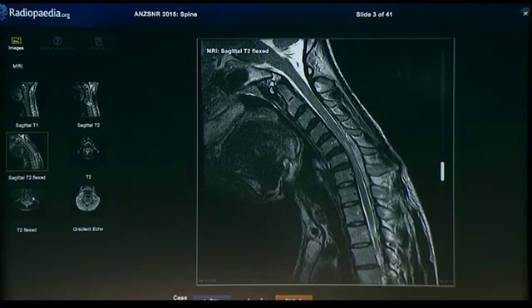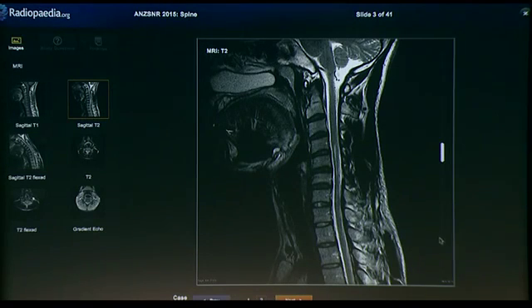So this is actually a fairly classic end-stage case in a patient who's 30. Now the classic presentation is late teens, early 20s, and it's a progressive disease that worsens in severity over 3 to 5 years. And this is probably at the end stage. I don't think there's much you can do for this patient at the moment. The time when you need to pick this is before the myelopathy has gotten to this stage, and at that point the imaging findings can be much less pronounced.